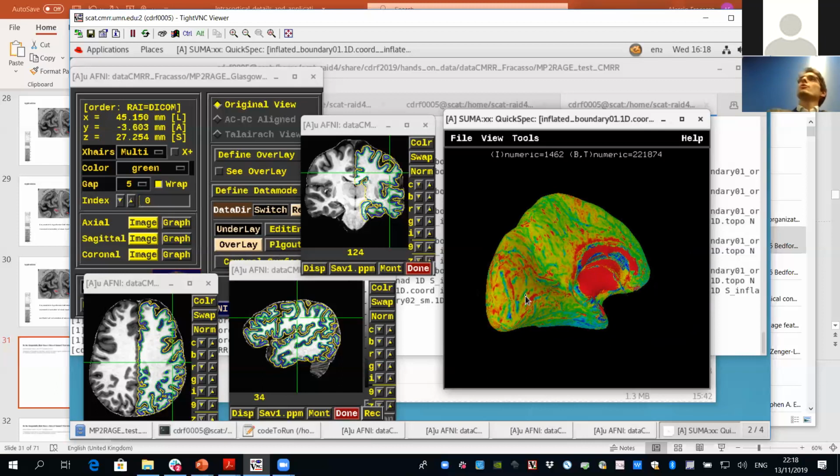I'm gonna show you the same thing from some data that I acquired in Utrecht at 0.5 millimeter isotropic. And I'm gonna show you the difference because it's gonna look much more smooth. So meaning that there's gonna be less error in the segmentation just because the quality of the image is better. Because instead of taking 1 MP2RAGE as here as a standard in order to derive a good segmentation, we take 5.